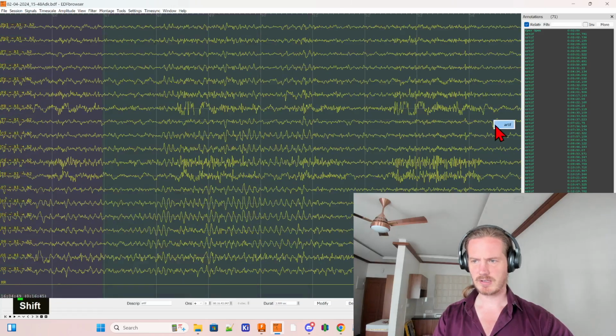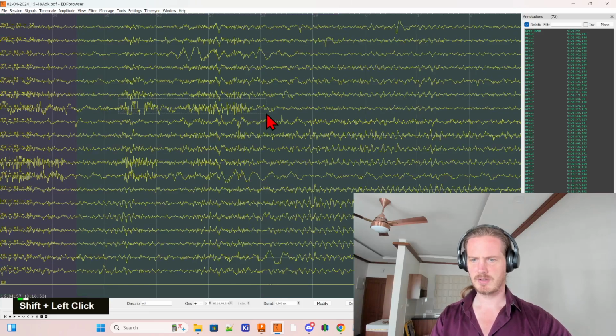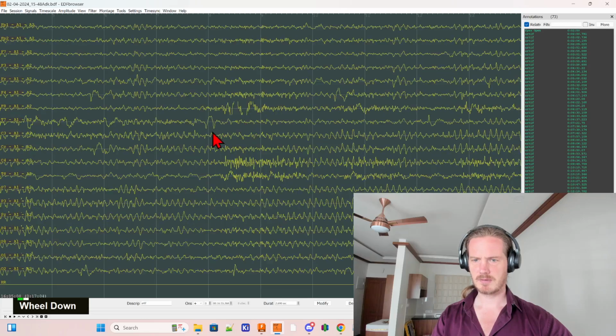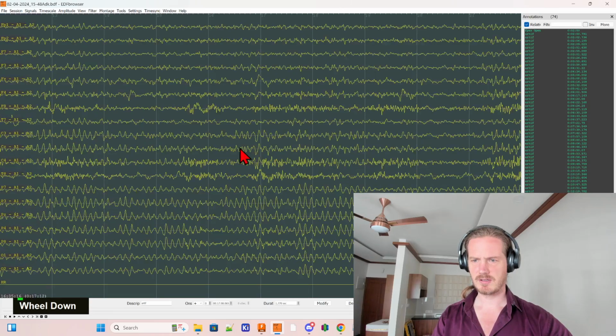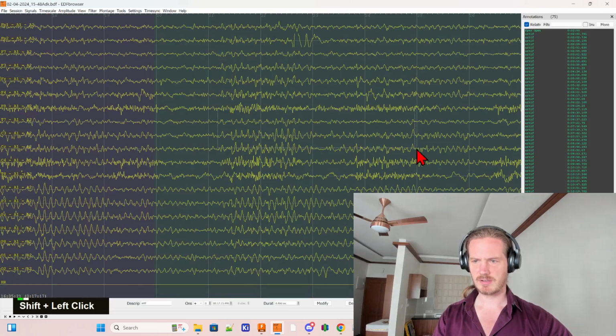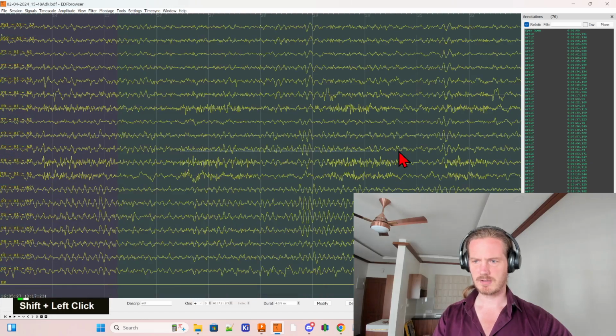This is a lot relatively for an eyes closed period, but it is what it is. Here we're getting some good data. I'm going to remove this part. I'm going to keep these, but these are above my threshold. There. And so is this. And so is all of this.